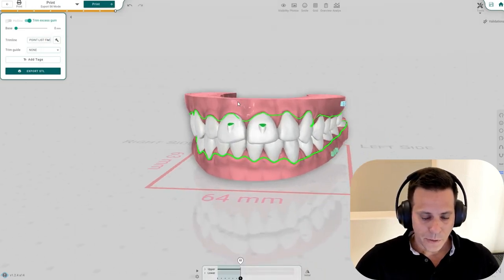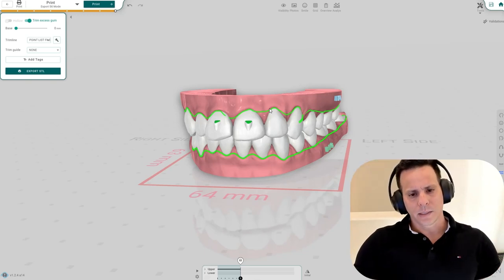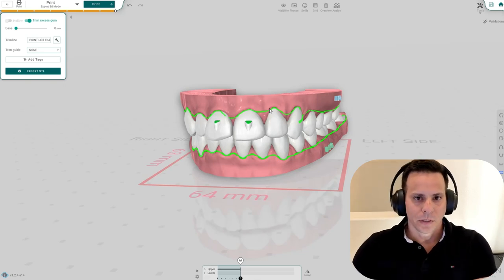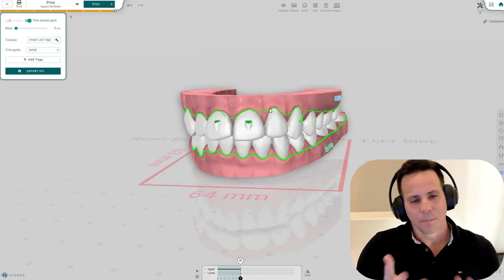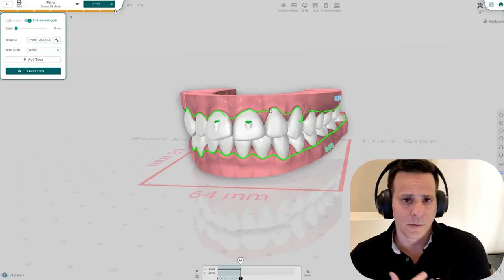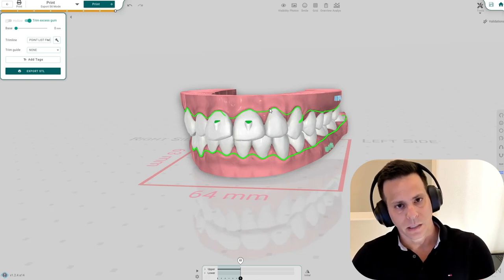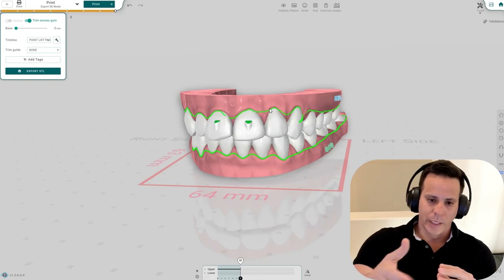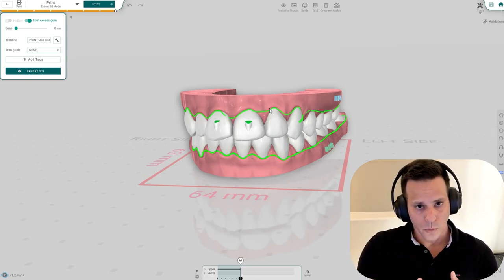There's going to be a lot more work into this and more options. But here you go. Now you have direct print support, the shell directly from Titan. And the good thing about this is that even if you're not using the shell, even if you're not doing direct printing, this still helps you. Why? Because the technology that was needed to create this shell is the same technology that is needed to do the hollow model and more advanced waxing.